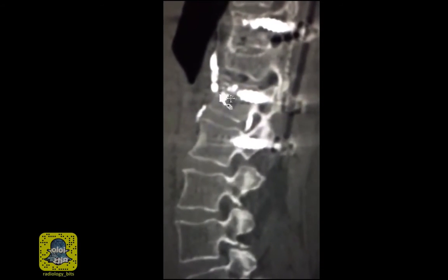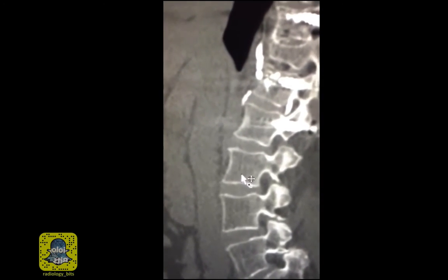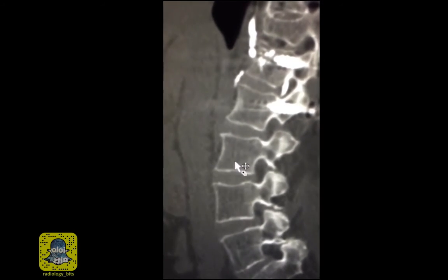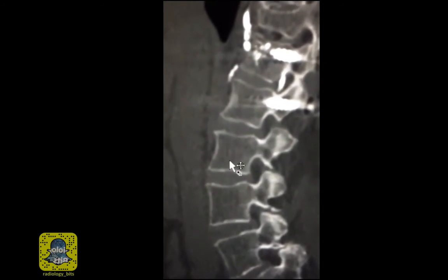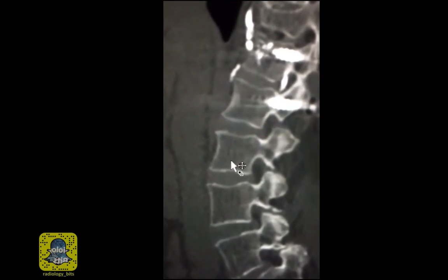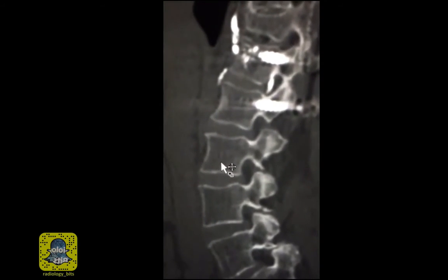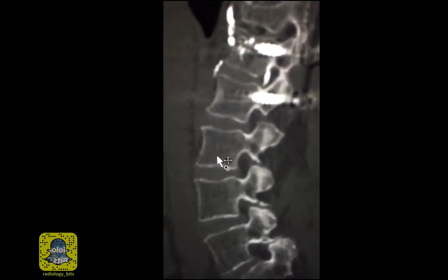Here's a sagittal image that shows the same thing. If you go to the side, you'll notice that you have these veins that drain the cement. And like any venous drainage, this would eventually reach the SVC, then the right atrium, then the right ventricle. And from the right ventricle, the material would reach the pulmonary artery. And as expected, the cement within the lumen of these small pulmonary arteries would eventually get stuck at the peripheral aspect of these vessels.